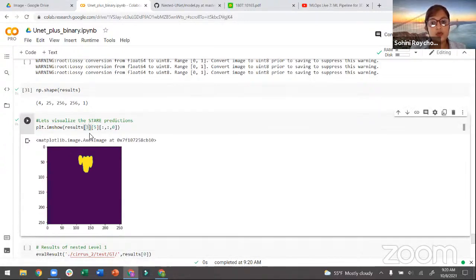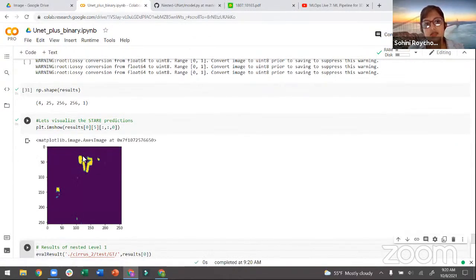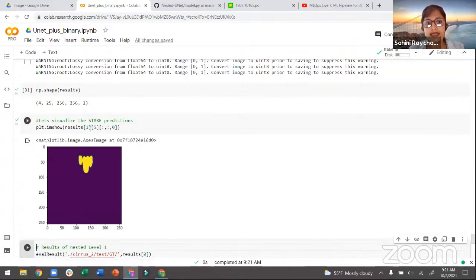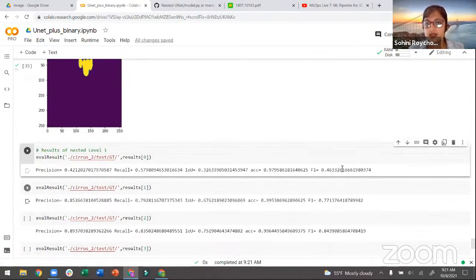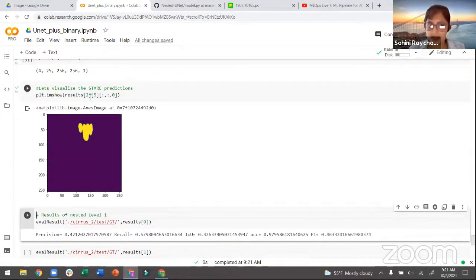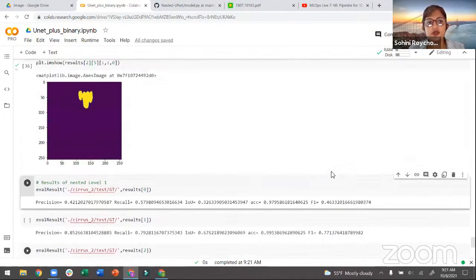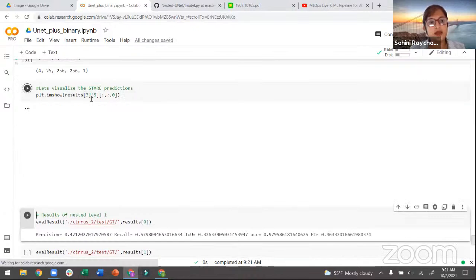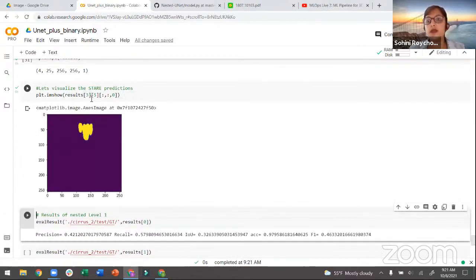Now let me show you what the output looks like. Let's start from the beginning, right? At output level 0, so depth level just 1, what is the output? You see here the cyst is not well segmented, so that's why this is not the ideal result, right? Now you go to depth level 1. At depth level 1, you see a significant improvement, and this is what we can see qualitatively as well, right? Now if we go to level 2, again, it is very difficult to figure out the differences between these two. The most significant differences are actually around the edges, the bounding boxes. And now if I go to the final level, then this becomes my output. So the edges become a little more defined.